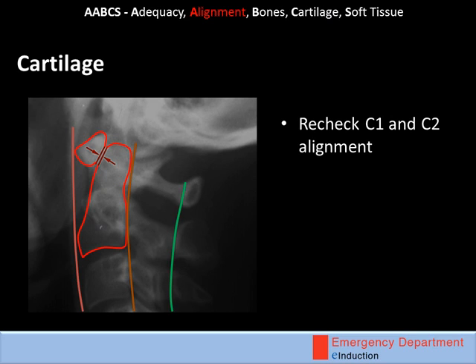Any fracture through the dens here can cause anterior or posterior movement. As the spinal canal is wide at this point, these unstable fractures can move significant distances before any damage to the cord is done. Sometimes patients with these peg fractures can walk into the department holding their head in their hands. They often tell you their head feels unstable. If this happens, then do take them seriously. I've certainly seen it once or twice before.